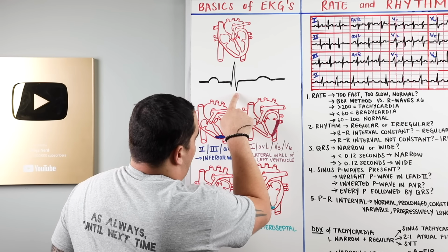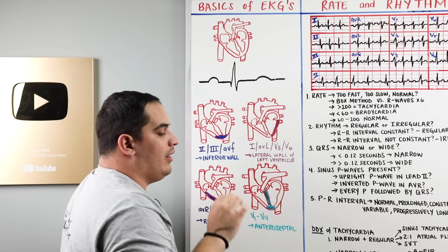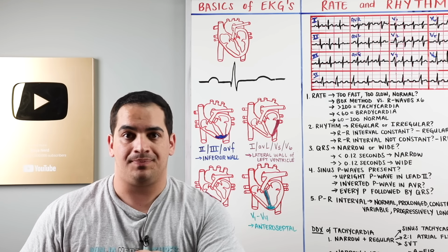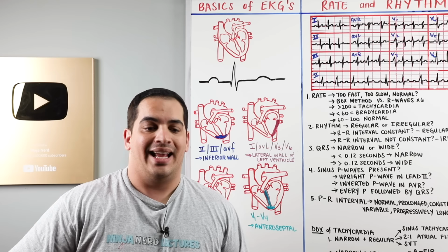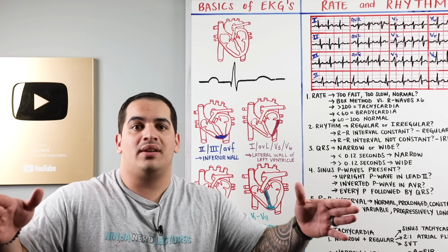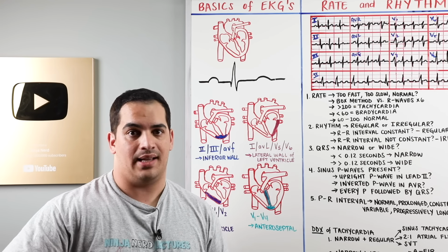After the QRS complex, you have this S wave. Right after the S wave, it goes up and then goes into this flat line. This here is called your ST segment. The ST segment is indicative of still ventricular depolarization, but there's no net direction, there's no net movement or electrical activity in a particular net direction. It's just the ventricles are depolarized, they're holding on to that positive charge, and they're just getting ready to repolarize. Okay? There's no net movement of electrical activity, no particular vector being directed. It's just the ventricles are still depolarized, waiting to be repolarized. That is the ST segment.